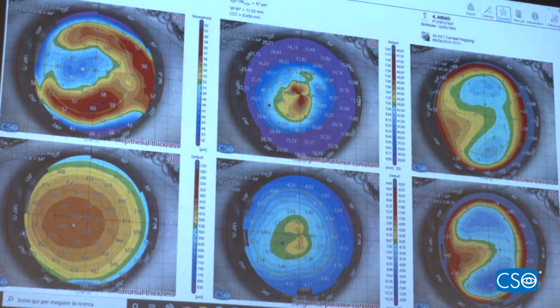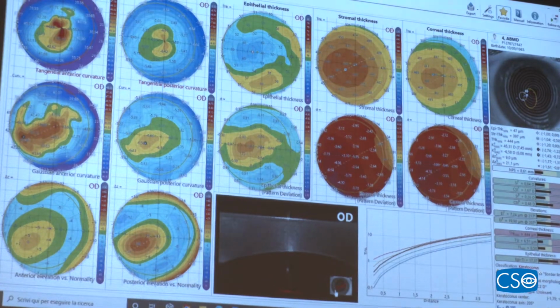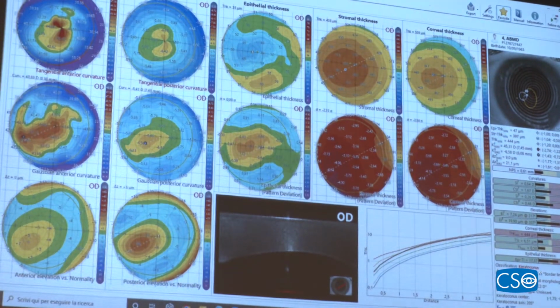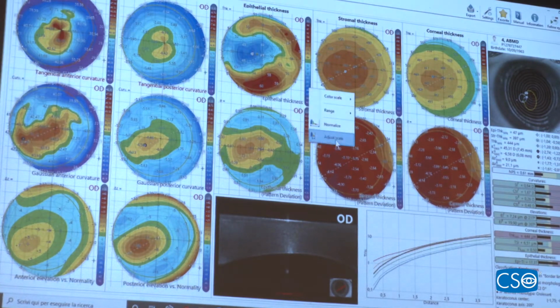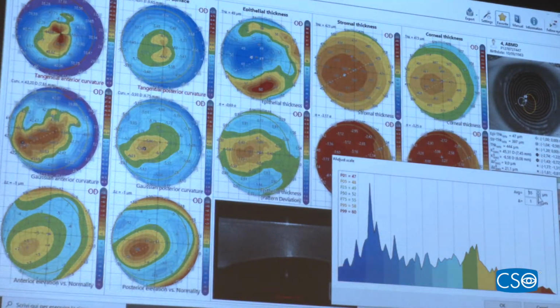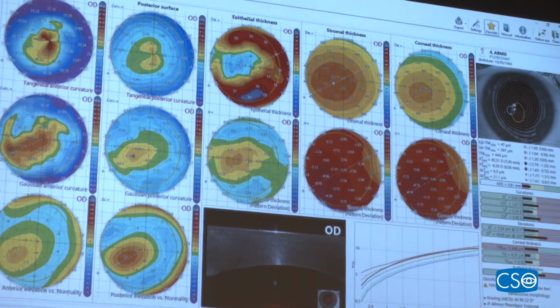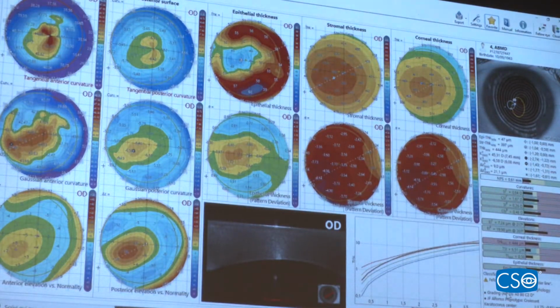So now we're going to go to our keratoconus display, and we're starting to get a little concerned here, okay? We place the cursor, it doesn't look too bad, but this is scary when you have concordance on the front and back surface, and the epithelium doesn't look quite right. There looks like there could be a cone coincident, right? Do you see that? There's something, and the keratoconus is classified here, right?